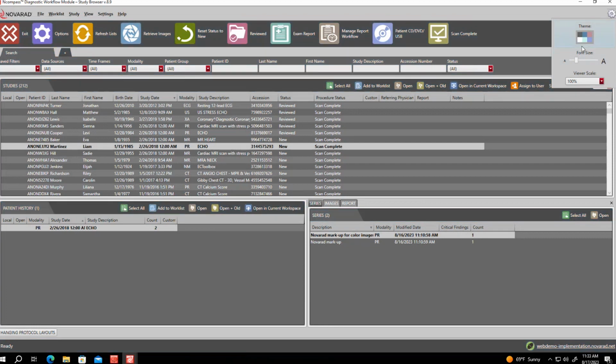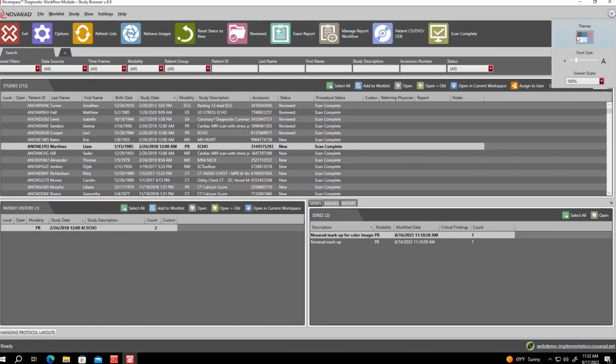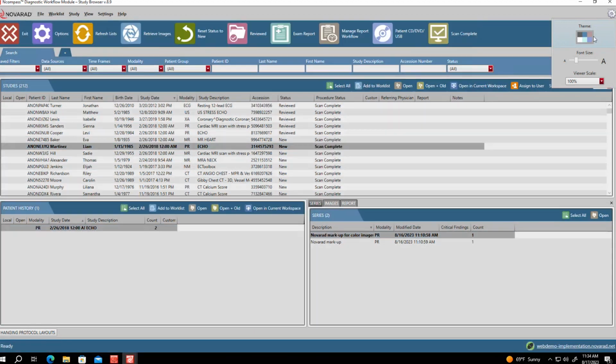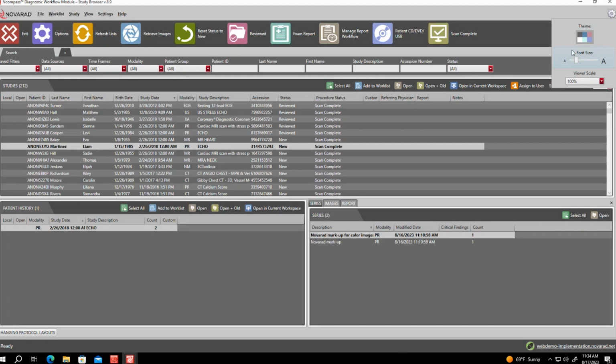And so they change the background layout for everybody. Some of the radiologists find it a little bit easier to view the darker color palettes so that it's not as bright of a screen while they're reading their images. Some of them like the extra light from the screen, so they can select our lighter color palettes. And if you have different staff who just prefer different colors, some of them want the light blue or the pink theme. It's totally dependent on user preference. But like I said, it only affects their profile, doesn't affect anybody else's.